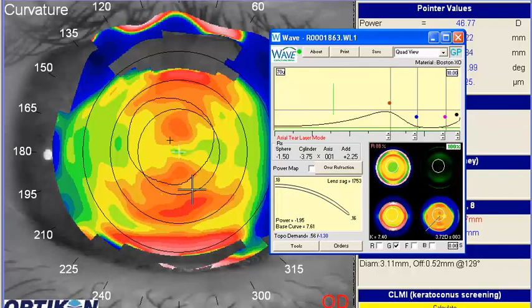I know, on a side note, most of the Wave designers tend to promote the axial design, and I am very comfortable with that. However, sometimes if I have a patient who's got considerable awareness with the lens, I'll switch over to tangential. If you recall, tangential tends to align the lenses more truly out here in the periphery, whereas axial tends to do a little bit better job here centrally. So that's just a little side note to keep in mind.